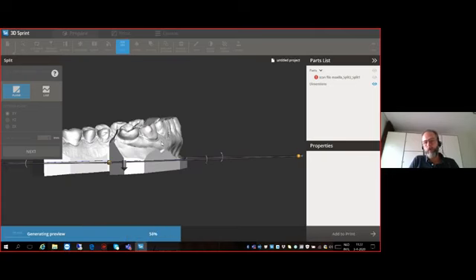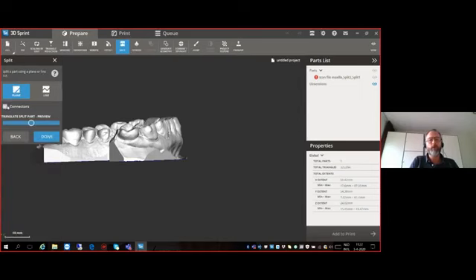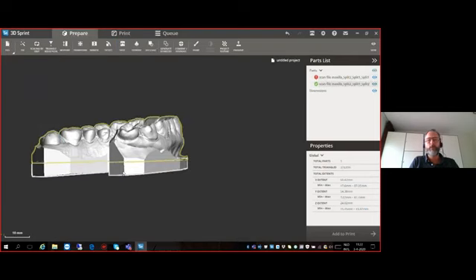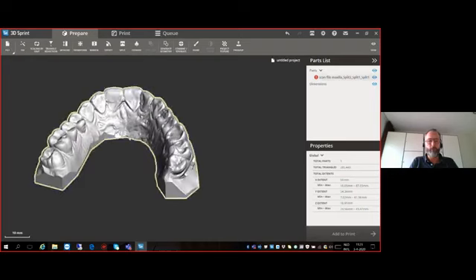Again, we select this option. We discard the connectors. We do not need them. The connectors are there if you want to have 2 parts and later on you want to reassemble it, like, let's say, with the Lego system. But this option is maybe used in industrial, but for us in dental, this is not something that we would use. We take off the bottom part and here we go. Now we have something that we can print.